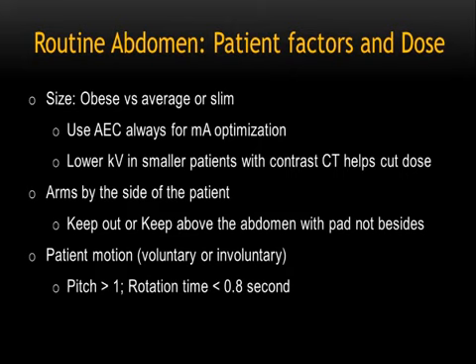Because not only does it drop the dose, but what's the most crucial part that makes you do a CT? Well, to pick up a lesion. Well, then if you have given a contrast to the patient, what's the best kV that you can use? The lower kV. So it not only makes sense from the dose point of view, but also from the point of view of being able to detect and see more things and being able to characterize more things, whether they are something to be worried about or not.